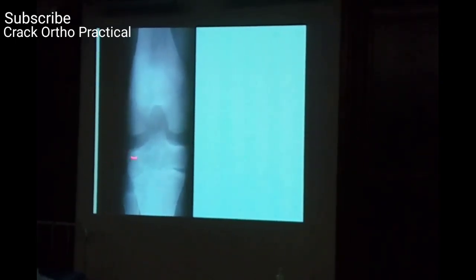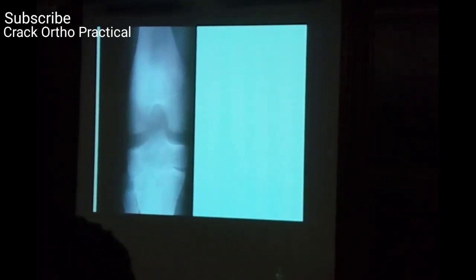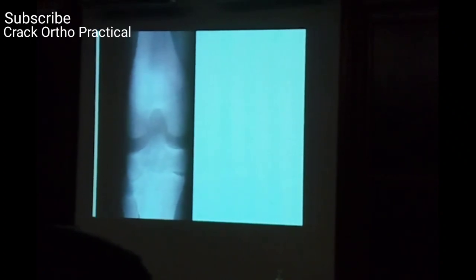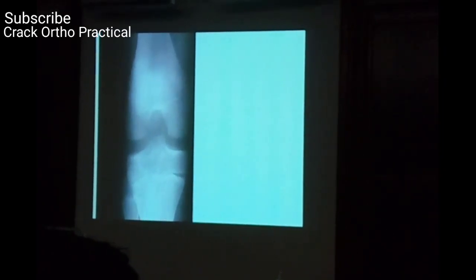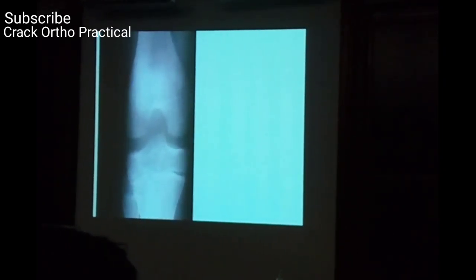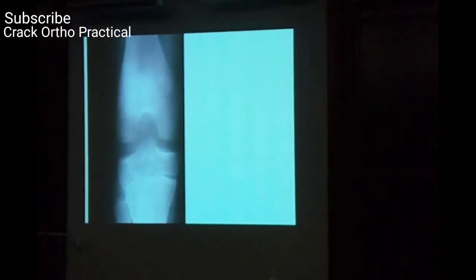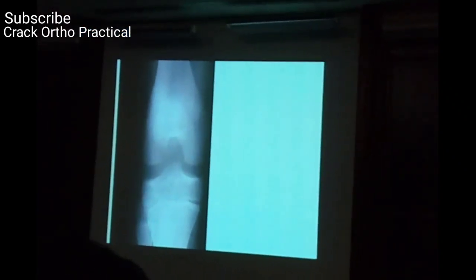There is a lytic lesion. Can you see here? Lytic lesion over the epiphysis of the tibia, centrally located, well circumscribed.